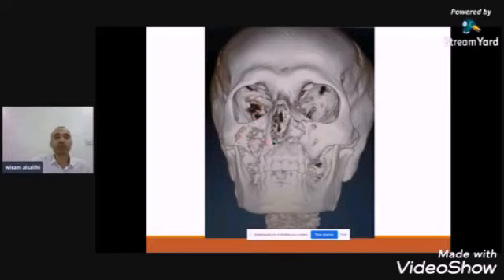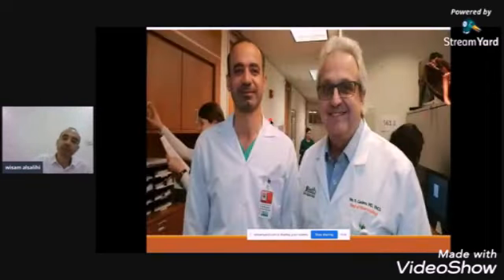So I appreciate from this picture that he is not a candidate for endoscopic surgery, and I did an external approach for him, Ferguson surgery. My appreciation to Professor Roy Cassiano, who changed my perspective on FESS and CT scan. And thank you.